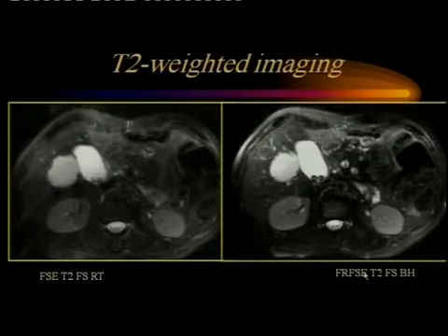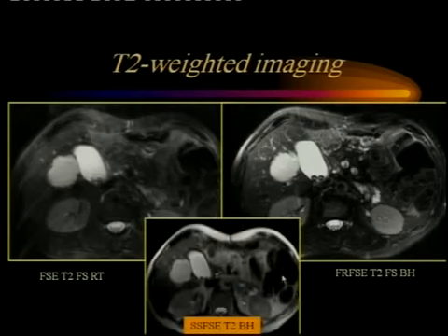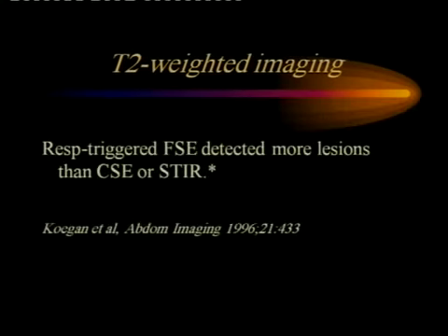But when we do the breath holding sequence, then you can see that there's much improvement and reduction of the artifacts. And even with the single shot sequence, although it's a bit more blurry maybe than the breath hold sequence, you can still probably get better detail in these patients who have problems with breathing artifacts.